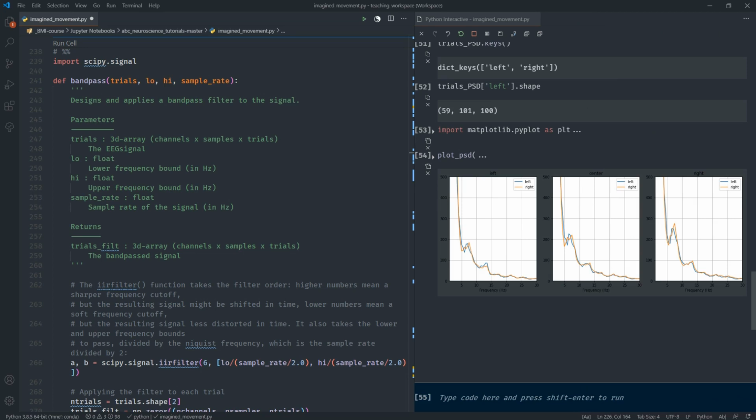We will use a machine learning algorithm to construct a classifier model that will distinguish between right hand and left hand movement of this given data. In order to do this, we need to first apply some steps. First, we need to find a way to quantify the amount of mu activity that is present in each trial. Second, make a model that describes the expected values of mu activity for each class. And then finally test this model on some unseen data to see if it can predict the correct class label.